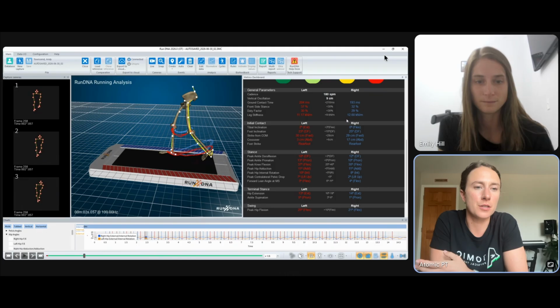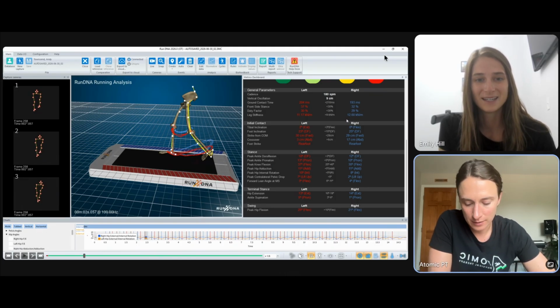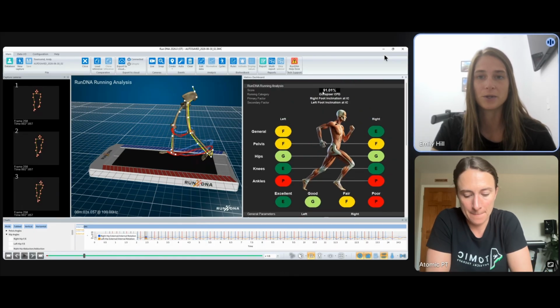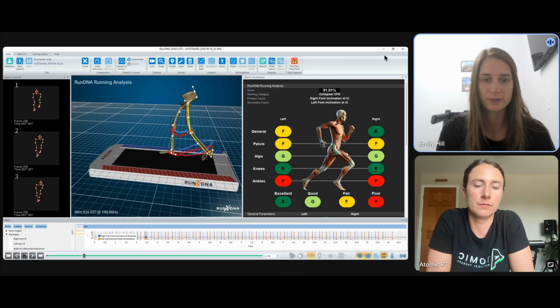Perfect. Yeah, that sounds like something you would review on follow-up gait analyses, making sure that those changes are actually happening, not just that he says they are. Yep, absolutely. We'd want to be looking at all of those numbers, and also paying attention to how this score number is improving as well, to tell us that we're landing more within those normative values as we make progress.